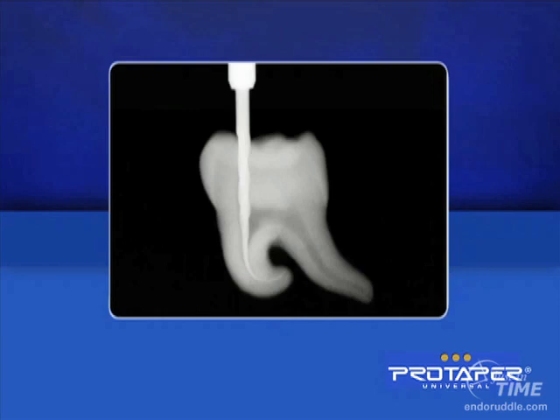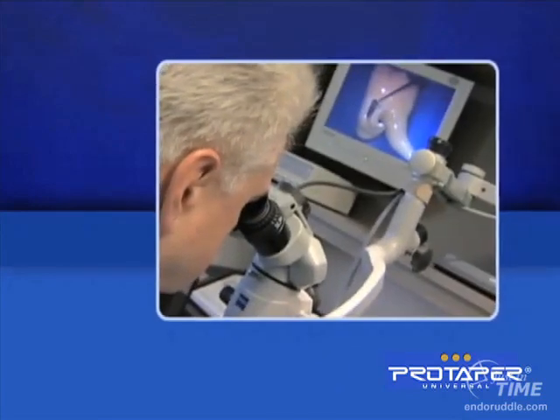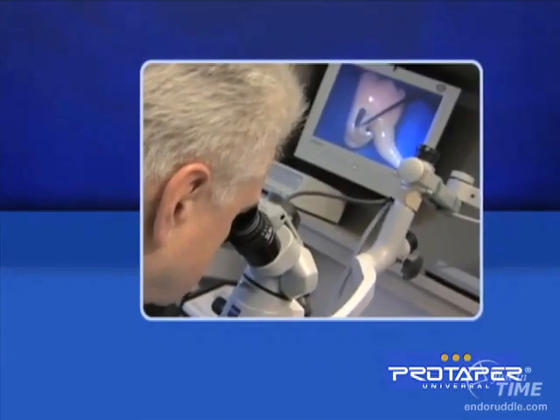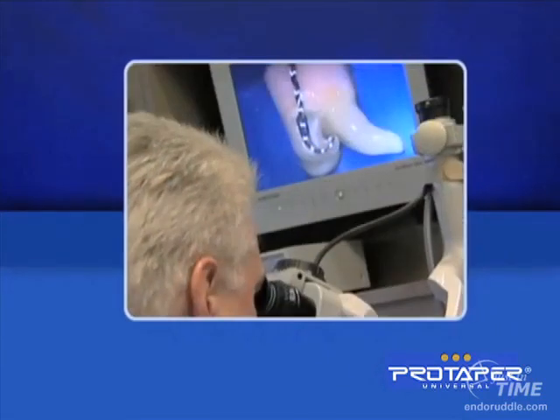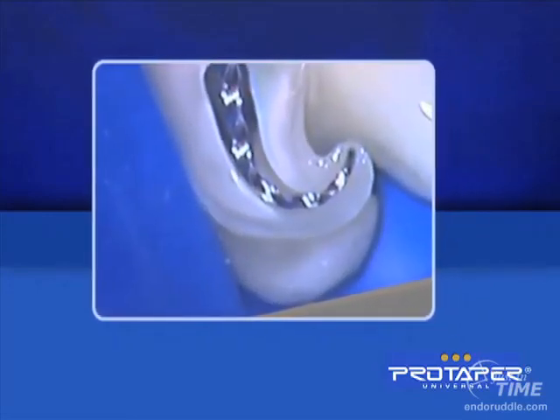I would never rotate a 25.08 F2 around this kind of a curvature, but manually you can see perfectly the instrument is around the curvature and at length. Well, if we go to the laboratory and look at some histological sections of that exact same tooth, you can see the principles of ProTaper on this shaved down root.